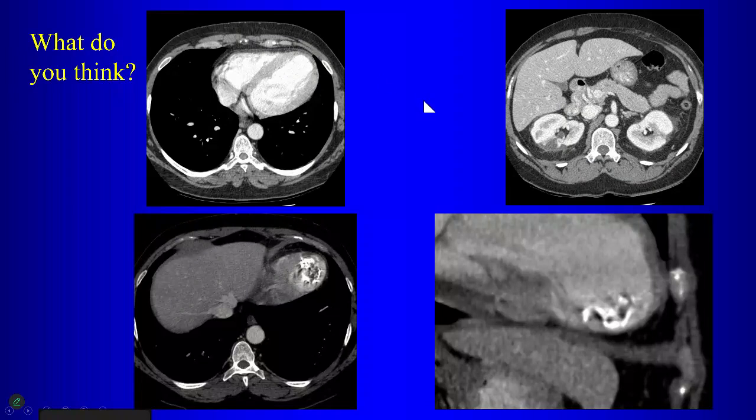What do we see in this case? Renal infarct from thrombus. Yeah, so in this case, you can see that the patient has bilateral renal infarcts, right? Where's the thrombus? Left apex. Yeah. Heart. So there's a filling defect here at the apex of the left ventricle, right? You can see that the apex is thinned. So this is from a prior myocardial infarction. The patient has developed thrombus in here, and this calcification is actually calcification in the thrombus.